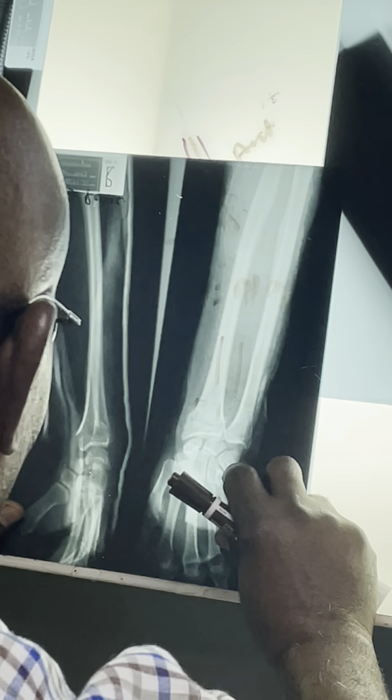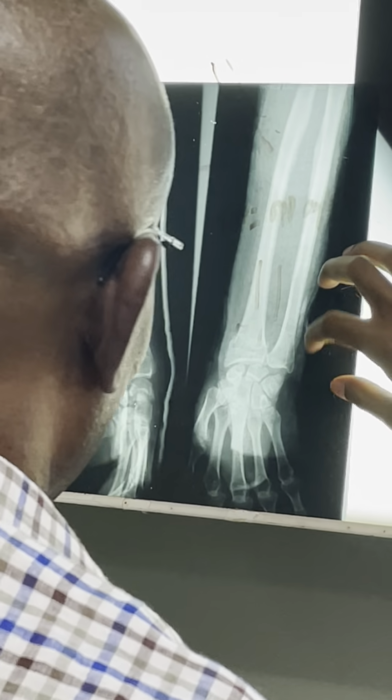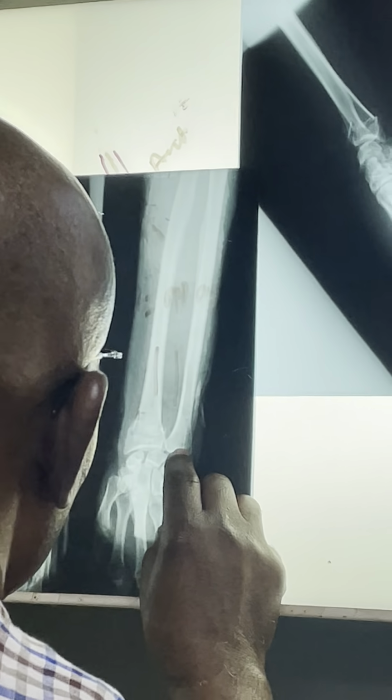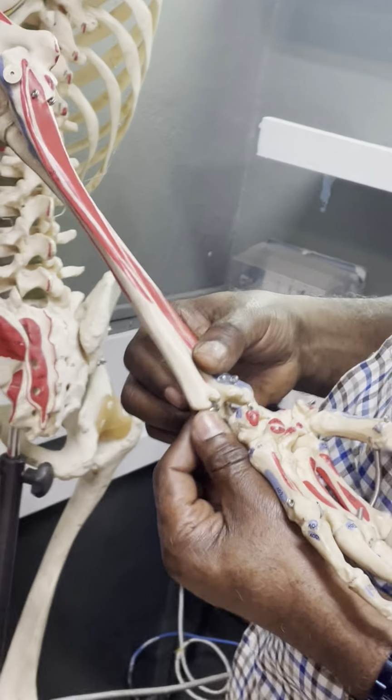So how did you see the ulnar styloid come off? It's because of this cortex. If you see, obviously the styloid will be pulled away, but I know you haven't read it in your book to show the principle of why it comes away.